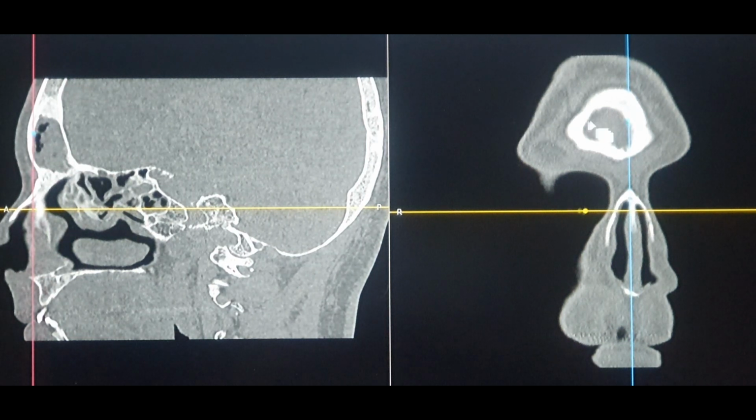Okay, so this is the exact orientation. Now that's the patient's center, or I can say the midline. Okay, this is the patient's midline. As you can compare over here, the axis on the coronal section is on the midline right now. So this will be a better understanding.